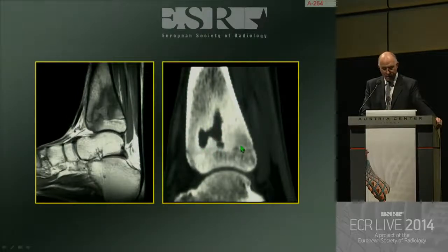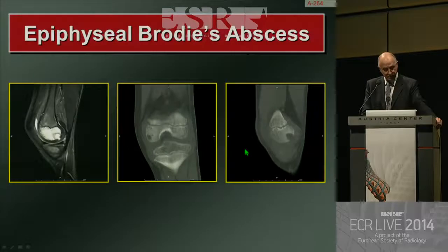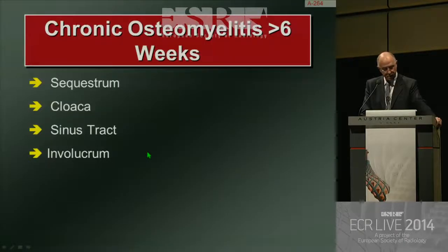contain the infective process. I've already shown you this picture earlier, but I'm showing it to you again because apart from the marrow edema and the area of bone destruction, please note that you also, after some time, have a penetration through the cartilaginous unossified component as well, and that can also go into the joint and cause a synovitis.